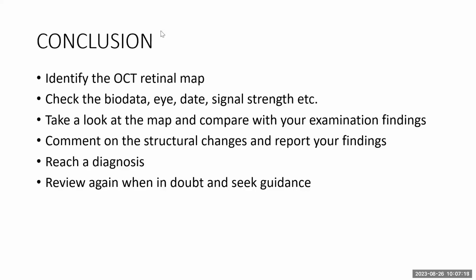Yes. So the drusenoid PED, the drusen itself is a bit hyper-reflective. The hemorrhagic PEDs are not hyper-reflective, they are hypo. You see this white dome of RPE elevation.